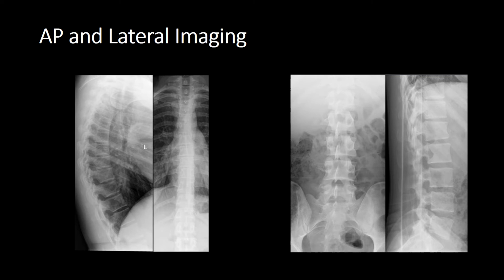Okay, so again, for a lateral, you want to make sure you've got T12, you want to clearly visualise L5, and you want to be able to visualise the L5S1 intervertebral disc space and part of the sacrum. So you want to go down your anterior longitudinal line, and that should be in alignment. Then go up your posterior line, and again, the alignment should be preserved. Check around the cortex of all your vertebral bodies.